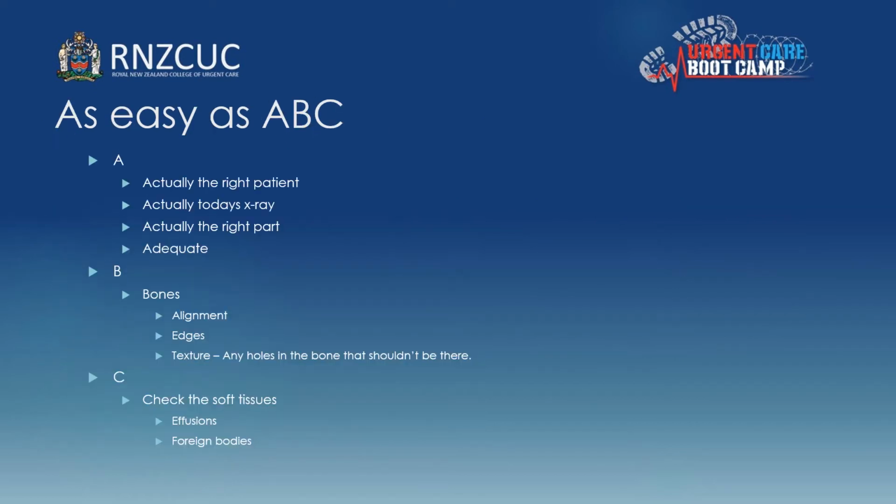So ABC. First, make sure it's the right patient, and actually either today's X-rays or the X-rays you think you were looking at. Make sure you're looking at the right part and whether the X-ray is adequate. Does it cover enough of the region? Is it technically well done? Is the lateral and things like that?